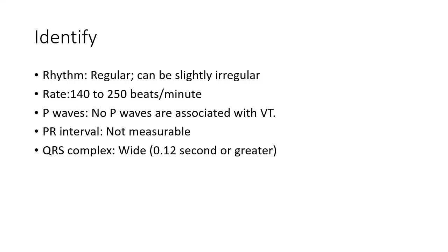I've even given you the answer in the thing. So tell me what that is. Ventricular tach. Yeah. I've got to get back in here and fix this. So again, everything in here leads to a ventricular oriented rhythm.